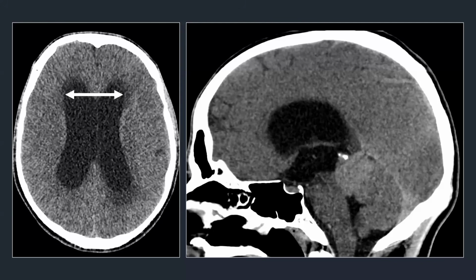Let's take a look here. We clearly have widening of the lateral ventricles, clearly seen also on the sagittal plane, as well as widening of the third ventricle. I have told you that if you're dealing with a hydrocephalus, look at the outlets or the narrow passageways. Now, the foramen of Monro cannot be involved because we have both widening of the lateral ventricles and of the third ventricle. Let's look at the cerebral aqueduct.